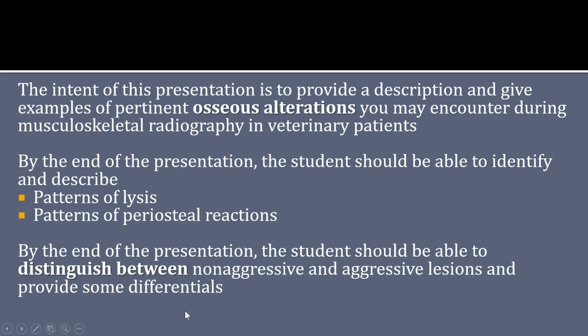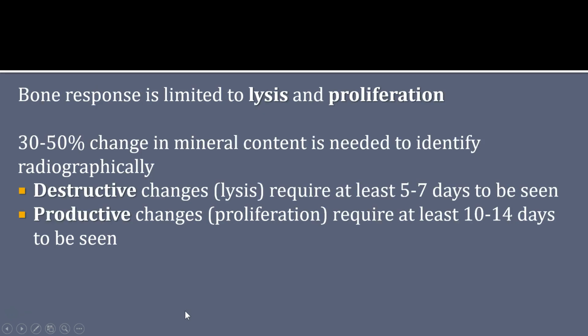By the end of the presentation, you should be able to identify and describe the patterns of lysis and patterns of periosteal reactions, and most importantly, you should be able to distinguish between non-aggressive and aggressive lesions and start considering some differentials. Bone response is limited to lysis and proliferation.